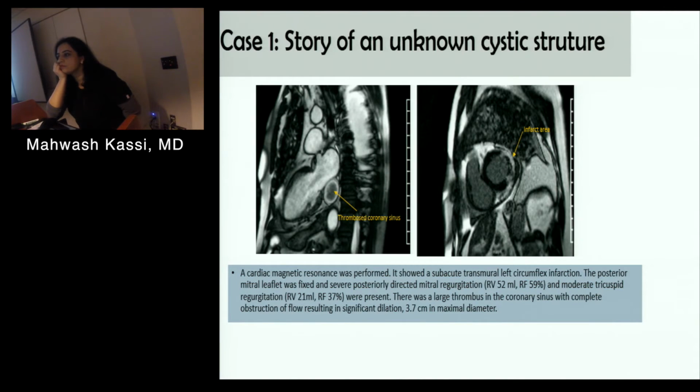Is it like a layered thrombus? Okay, so your differential here is that this could be a layered thrombus. What else could it be? There are two things in the differential here. Microvascular obstruction, right. If you have microvascular obstruction, there's an area in the center of the infarct that doesn't take up contrast initially. So both a layered thrombus or microvascular obstruction can give you this.